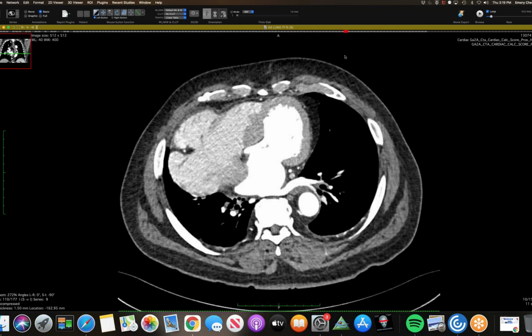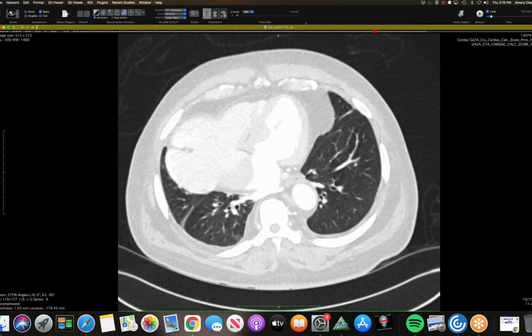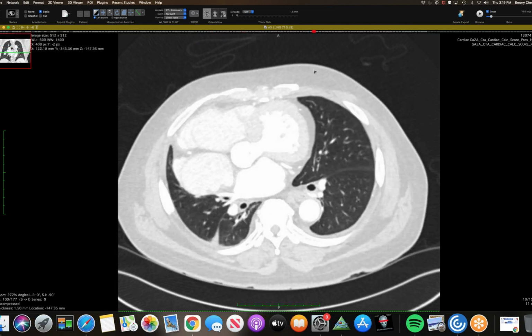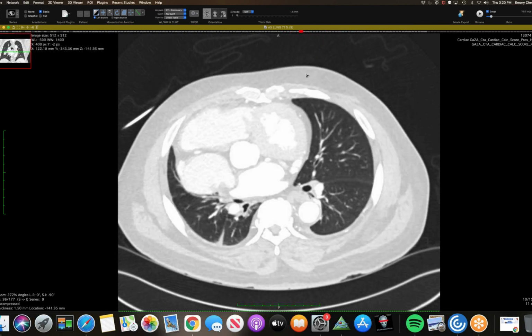And then a few other incidental interesting things on this one. They're sharing the inferior pulmonary veins. They're sharing a common ostium here, and couldn't really find the minor fissure. So the middle lobe may be kind of hypoplastic or just very compressed from that herniation.